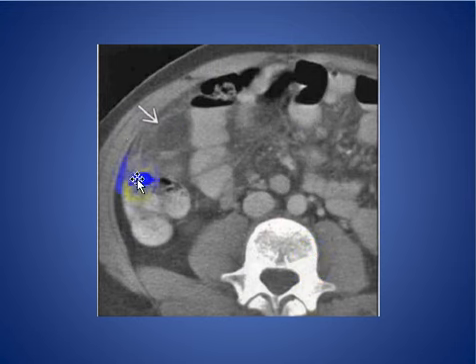As we see here in the axial CT scan, omental infarction: oval mass lesion with fat density adjacent to the ascending colon in a child patient with focal tenderness. No surgery needed for this mass.